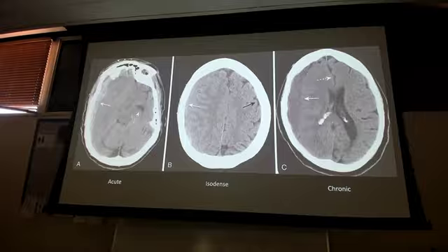So there are two ways to notice if there should be a head bleed or a mass in the brain. One, I can see the blood, the acute bleed. Two, even if I can't, do I have a midline shift? Because if I do, something's pushing that over, right? The head is this nice contained area. It's only got enough room for the brain and the vessels and the CSF, and that's about it. If something's there that's not supposed to be there, it's going to push it over. It's soft, it's squishy, it goes right over. We'll see more of these.